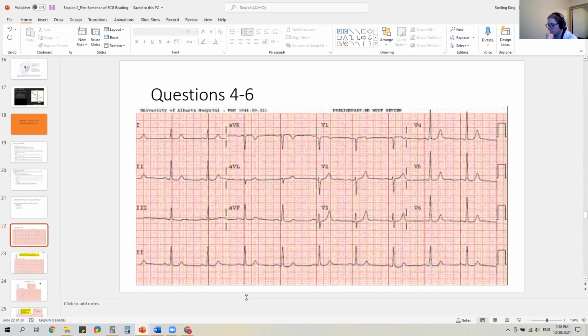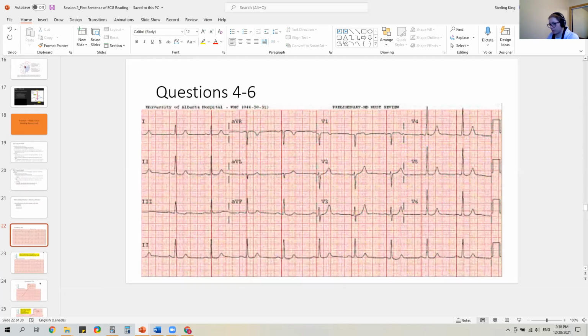So if we were to do this, I could put rate, axis, rhythm, and intervals. I'll work through this one, and then for the next one you can pause the video, work it out, and hit play again, and I'll read through it.